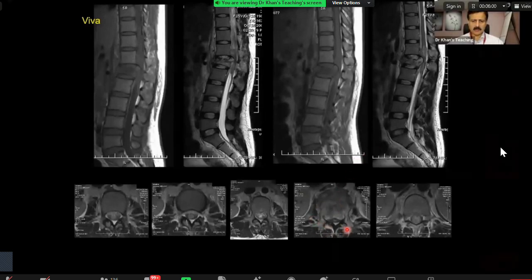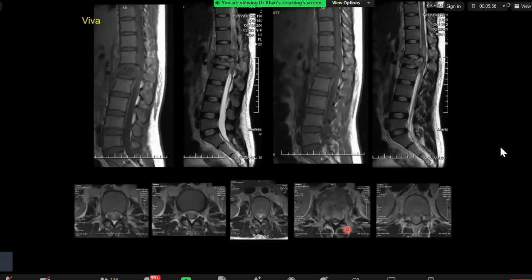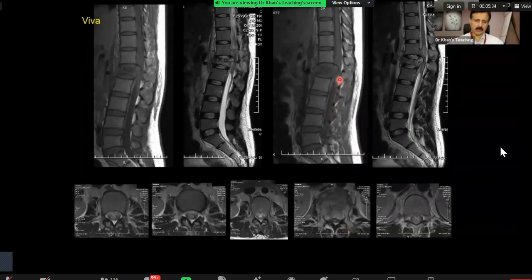So I can see there is abnormal cortical bulge posteriorly, and there is also complete effacement of the spinal canal with cord compressions at this level. Okay, and what is happening here? Anterior to my mouse, in between the mouse and the vertebral bodies.